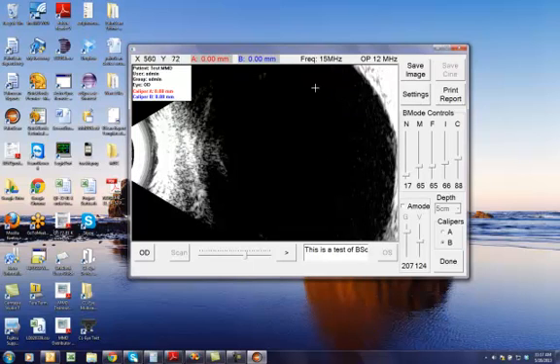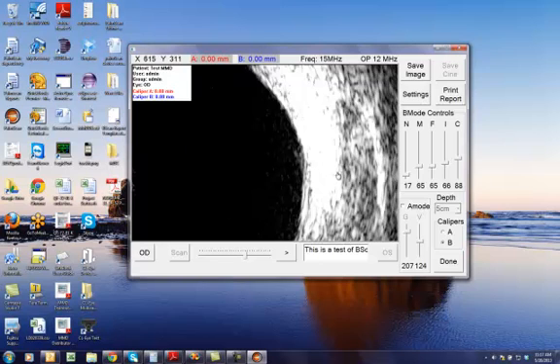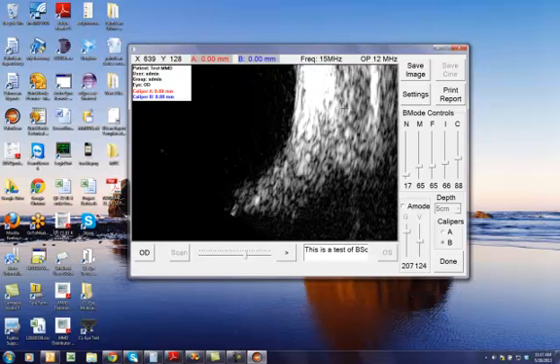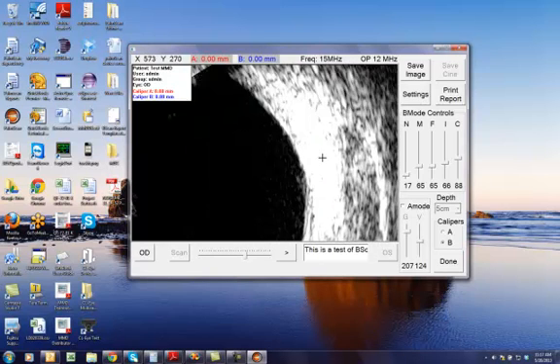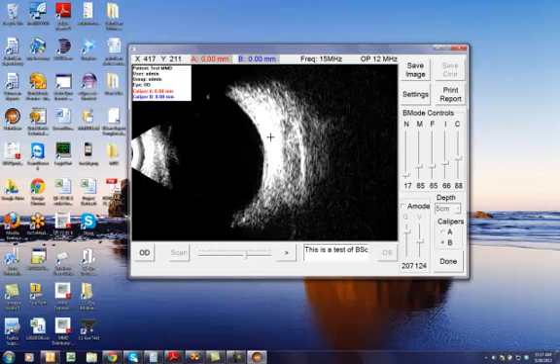Now you will get a zoomed in version of the image. Now you can use this left mouse button to press down and drag so that you can pan the image to anywhere that you want to look at. To unzoom, you double click again and it goes back to the original zoom. There's only two zoom values available, the zoom out and zoom in.